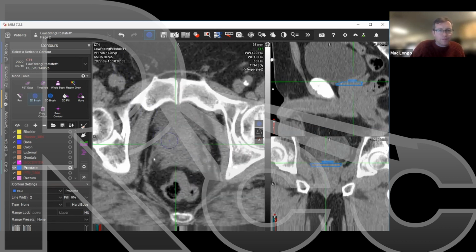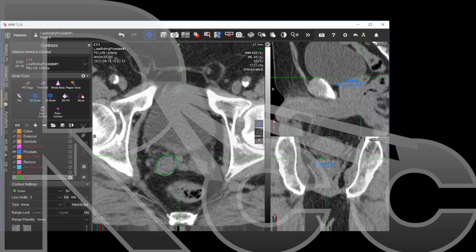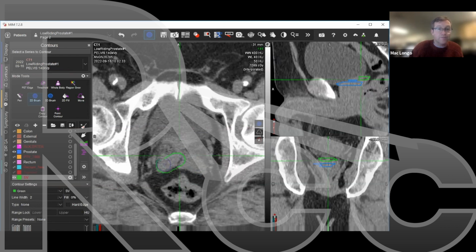So as we're talking about appropriately contouring the base, the other structure that we pay attention to are the seminal vesicles. We can clearly see the seminal vesicles here, superior and posterior to the prostate themselves. But again, the prostate anatomy impacts the positioning of the seminal vesicles. In younger gentlemen that have a smaller prostate, the inferiormost aspect of the seminal vesicles are embedded within the prostate itself.